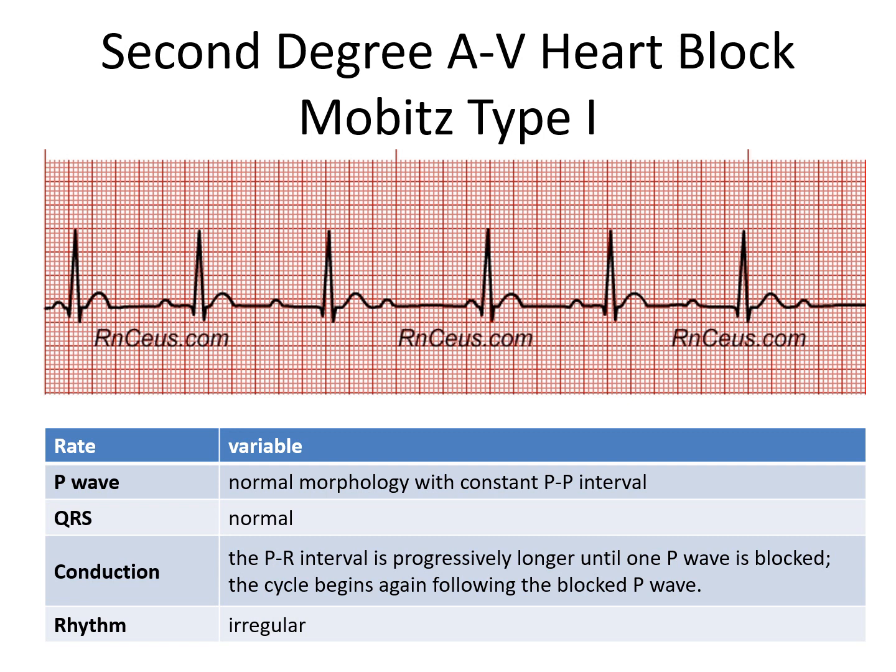Notice you measure the PR interval. Here it's clearly less than 1 big box. The PR interval here is greater than 1 big box, so it's already prolonged. But look at the next one. Look at the PR interval here. It is even longer. So we say it gets long, longer, drop. The PR interval gets increasingly longer until one of the P's is blocked right here. Okay.